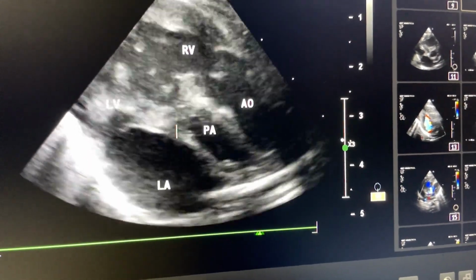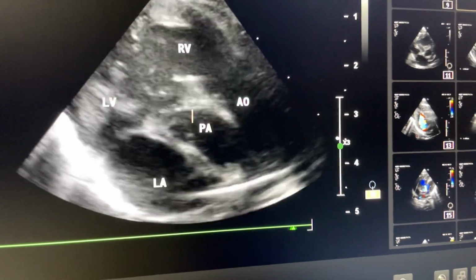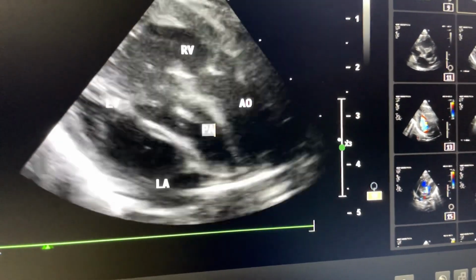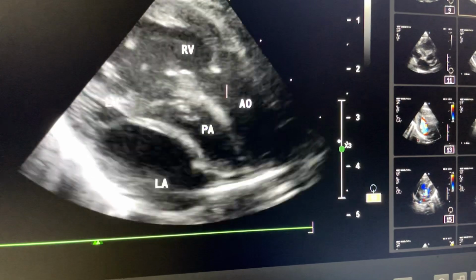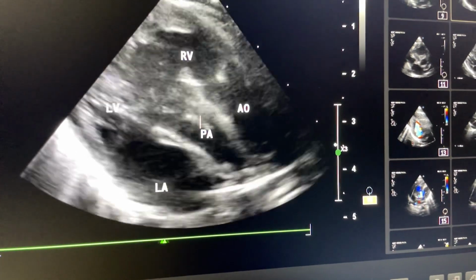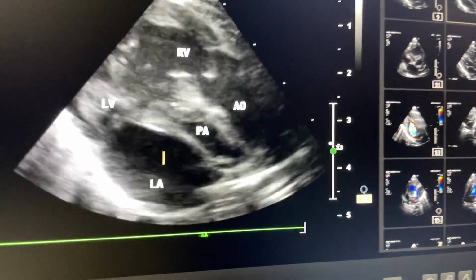So the beginning part of the great arteries coming out of left ventricle is very important. If it goes posteriorly, indeed it is pulmonary artery, not the aorta. At the same time, you see the beginning part of both pulmonary artery and aorta is parallel. So whenever you get parallel, that means transposition. So in this case, it is D-transposition because there is AV concordance and VA discordance.